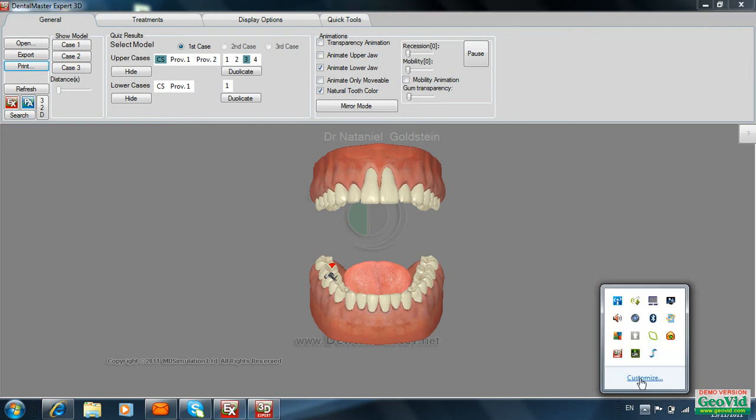And this is another short tutorial of the Dentalmaster.